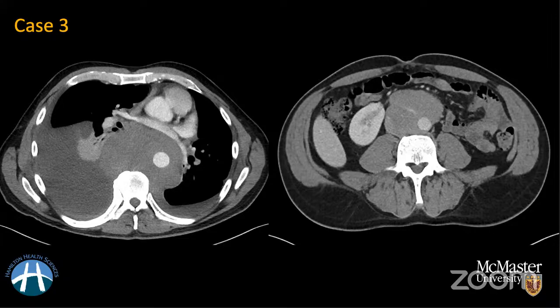And usually it's lethargy and some weird abdominal symptoms. It's like all B kind of symptoms. And then on imaging, you will find these large lymph nodes. What is more important here is that the primary testicular masses may or may not be that large to cause all of these lymphadenopathy. Like in this particular individual, the primary testicular mass was really small. It was just about less than a centimeter in size, but it's usually homogeneous, hypoechoic to the testicular parenchyma, and it usually does not go outside of the tunica.